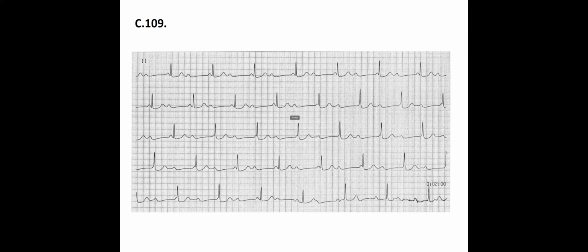So in this ECG, we have a regular RR interval, but the heart rate is slower than the normal range. And there is a prolonged PR interval because it's longer than 5 squares every time, but it is constant in all of the beats, and every P wave is followed by a QRS complex, which made me think that it can be a first degree AV block.